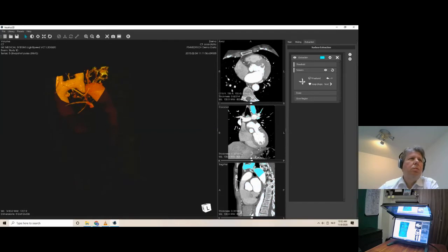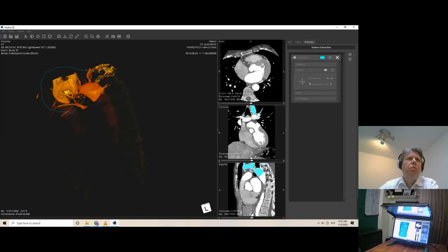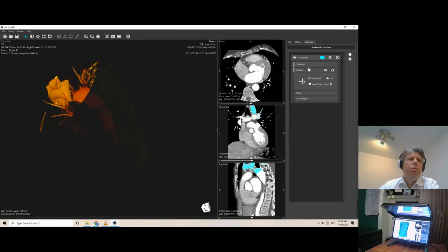This is beautiful. Make some more selections. Okay. What do I want to keep? I don't want this. No, I want this to keep. So I go through it. For example, we do it one more time. This is what I want to keep. Turn it a little bit more.